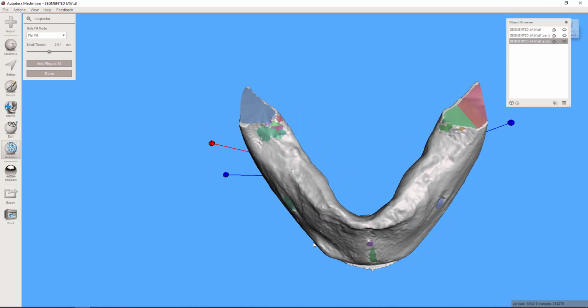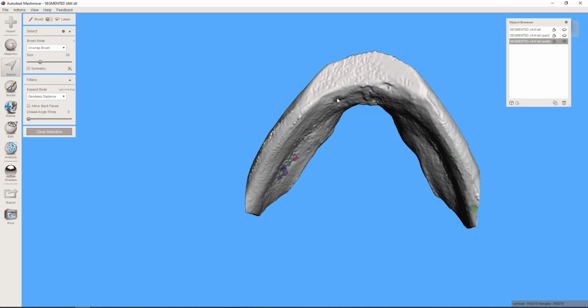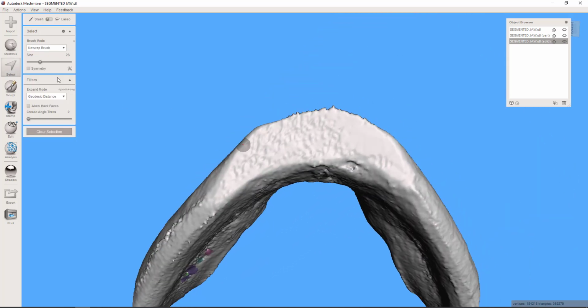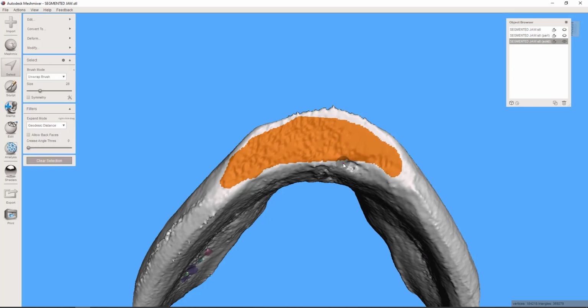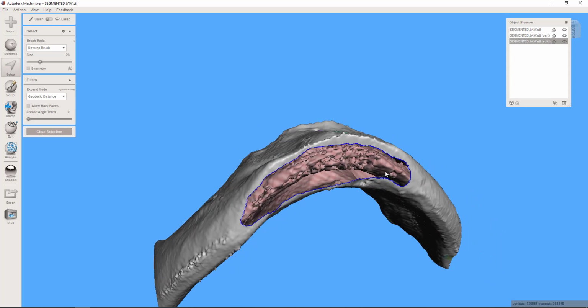And now we know we've still got some bits of floating mesh inside, because remember, we've still not dealt with those. How can we find out? Well, a bunch of ways you could. One easy one is, you're going to have a flat area down here at the bottom extent of this. So even if you deleted all this, if you just repair it with a flat fill, then it's no problem. So now I can see all that stuff inside.